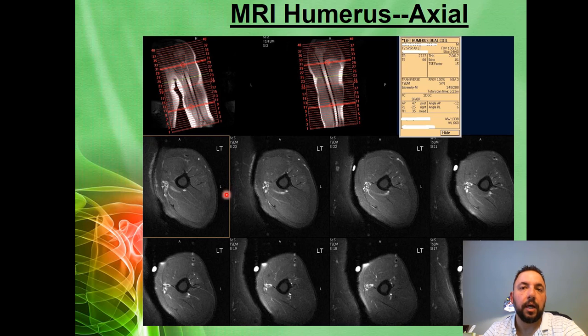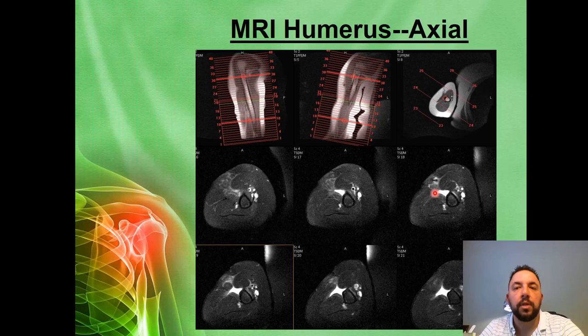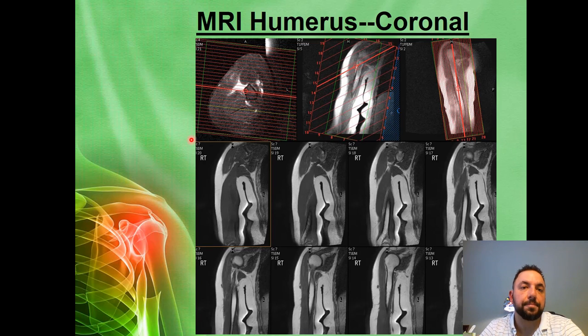particular region of interest. And a T2 fat sat here, again, good adequate SNR. This is even acquired on an open MR using dual flex coils around the patient that we're able to get decent enough images, a whole 40 slice, 2 stacks of 20 approach, so the table moves for each stack of 20, that you get adequate SNR and you don't get drop off at slice 1 versus slice 40. So always try to see if you can move the table per stack of 20 and it'll fuse together into one group for your radiologist. But it definitely gives you adequate signal, and you want to have the smallest field of view possible on the axials so that you can see pertinent pathology a lot better with adequate spatial resolution.